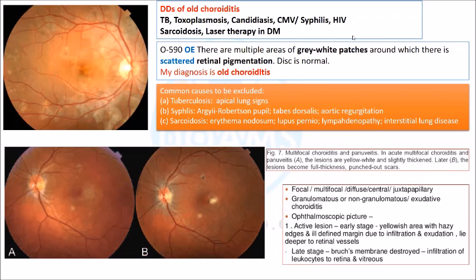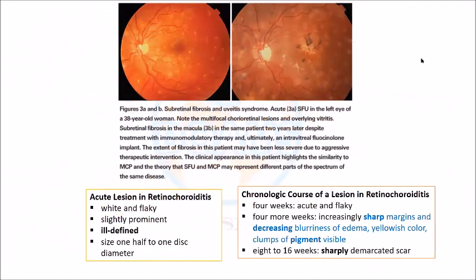And a very important differential diagnosis is here. Most commonly tuberculosis, syphilis, right? Sarcoidosis and infiltrating disease can also cause this type of appearance. So look at these first, then diagnose the underlying disease. This is the challenge. So this is the choroiditis. Again, I believe that our candidates, and regarding myself also in my initial stages, actually know very little about this area, the choroiditis and others. So look at the picture again.